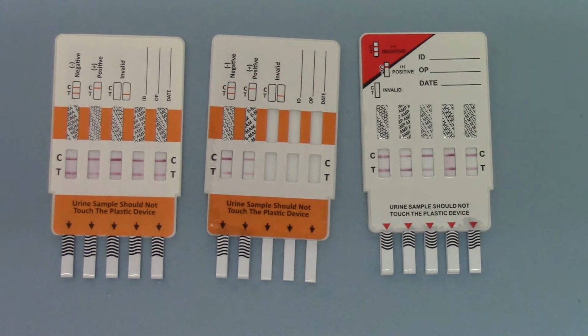So on the 10 panel you'll get 10 results for those 10 drug groups, the 7 panel 7 results for the 7 drug groups included, and on a 5 panel or smaller panel you'll get 5 individual results. The mechanism for running the test, the procedure in terms of the sample collection, dipping and interpretation of the results are identical for each. The only thing you need to be aware of with the bigger panel combinations is you have got a reverse and a front side, both of which you need to be aware of and read the results.